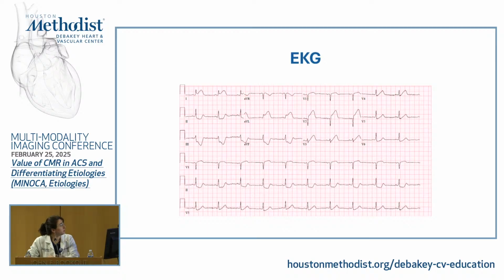On EKG presentation, as we can see, there are ST elevations in anteroseptal and anterolateral leads with reciprocal changes in the inferior leads.